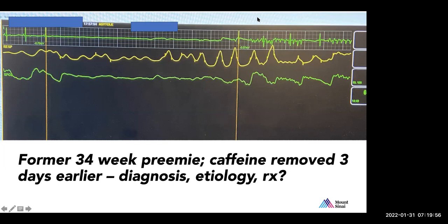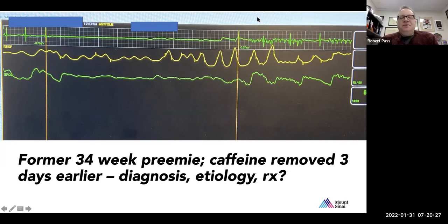If we look at the respiration, I wish I could see what was happening before, but I can see that closer to the end of this sinus pause, we see some more active breathing based on this respiratory line. So maybe this sinus pause was preceded by an apnea event, and the saturations during the sinus pause are also down. I wouldn't read very much into that sat tracing. It might be real, but it's pretty hard to interpret, right? Especially since there's not even a scale.